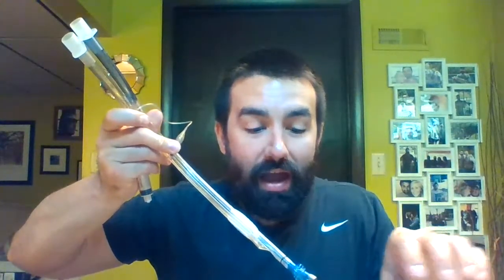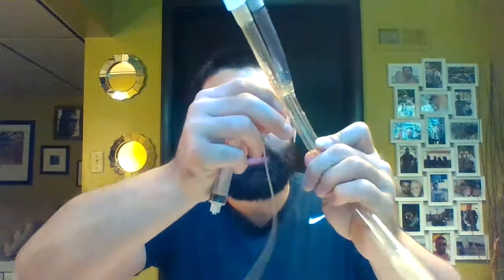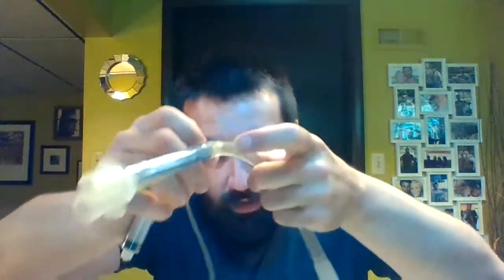We can inflate both balloons, and it allows us to direct that air out of one tip into one lung. And then we have this balloon sealing everything up and above. This balloon would keep air from going down into the bronchial intubation, and that other air would ventilate the other lung here. Sometimes they'll have a single pilot balloon. I have seen a couple of doubles, but mine are torn. You can see one here, one here.